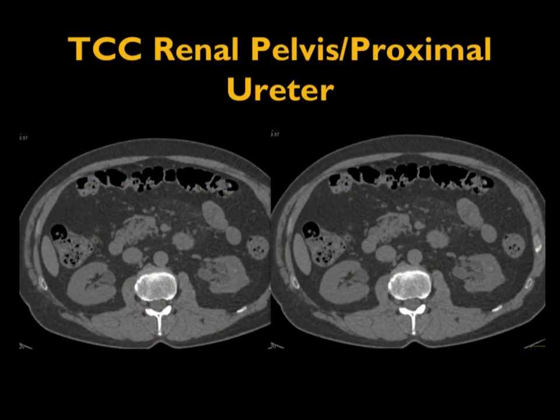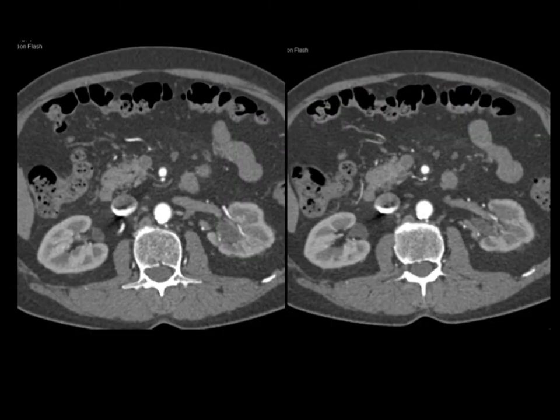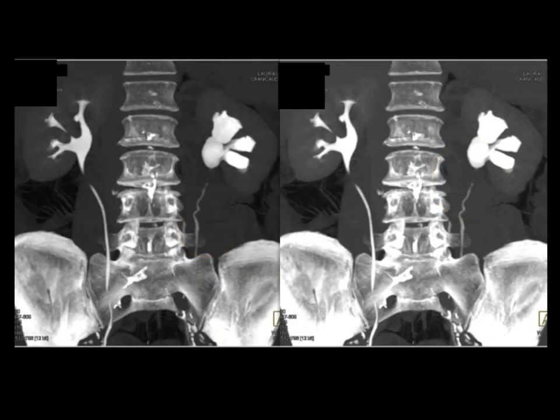Another example. Here the left kidney looks like it's irregular shaped. Are there parapelvic cysts present? Give IV contrast. Perfusion changes are seen. What's going on by the pelvis? Very subtle. Look at the patient's left ureter proximally. Is that a UPJ? Well, when you look a little bit more carefully, there's thickening there, and at the UPJ, there's real narrowing beyond what you might expect to see with a UPJ. And you look at it in the coronal view, and it really bothers me, those calyces on the left. But again, maybe it's just obstruction by a tumor that's small.